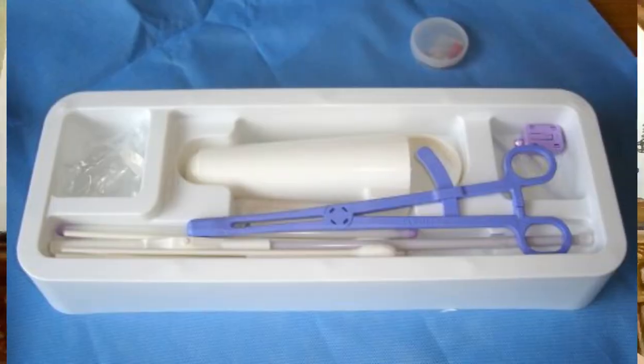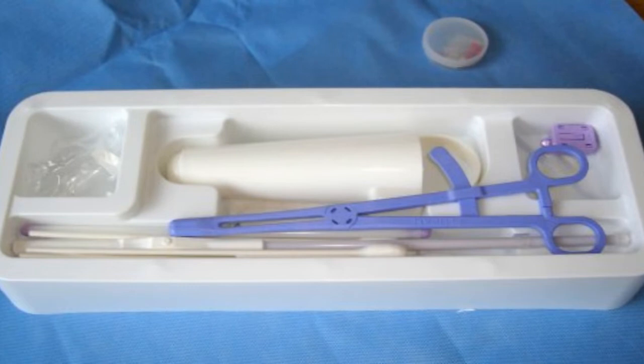we'll explain to the mom the situation and explain that we will do digital scalp stimulation, do vaginal examination and digital scalp stimulation, and document the reaction. If there is acceleration, this means that the baby is healthy. If there is no acceleration and the CTG is still pathological, review the situation with the senior, with the consultant, and review the situation with the mother, and consider doing FBS, fetal blood sampling, or expediting delivery according to the maternal preference.